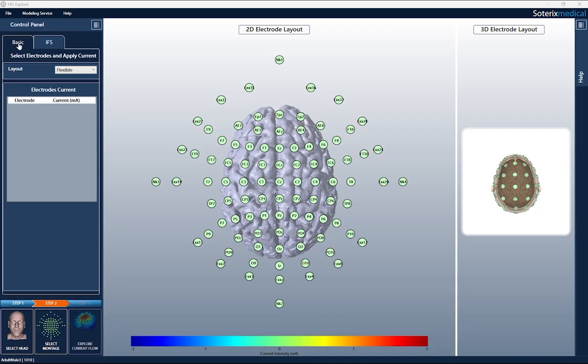You will notice 2 different layouts are available, by which electrodes, their current, and polarity can be selected via the drop-down menu in the Layout tab. The flexible layout allows you to select the desired electrode and assign its current and polarity. The uniform option assigns the same current to a group of electrodes for the selected polarity, anode or cathode.